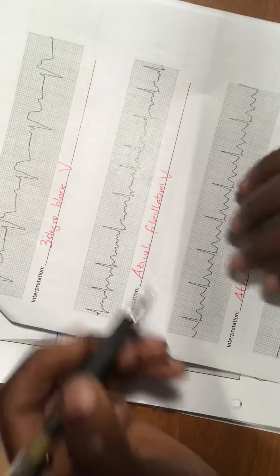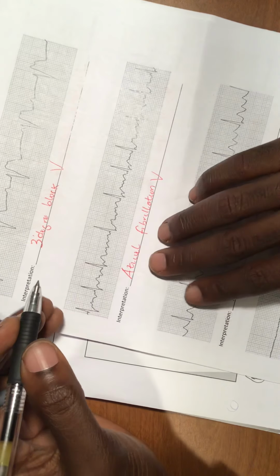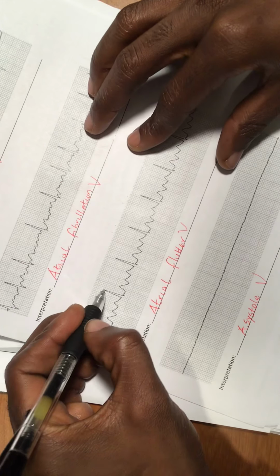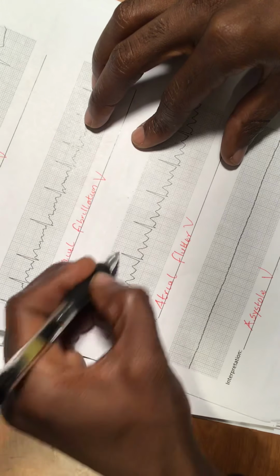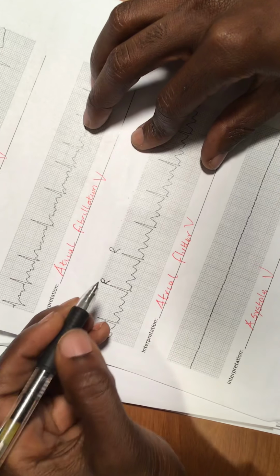I'm talking seriously now. I'm going to show you exactly what I'm telling you, because that is very, very important to know about. This is not something very easy, but I have to show you something very important. Look at that, even though we are not there yet. See what's really going on. We are in the presence of an atrial flutter. Right here, see the R to R. This is our R right here, and this is another R right here. This is atrial flutter.